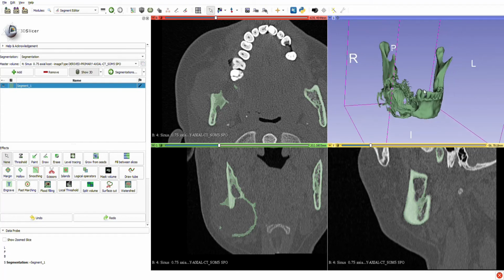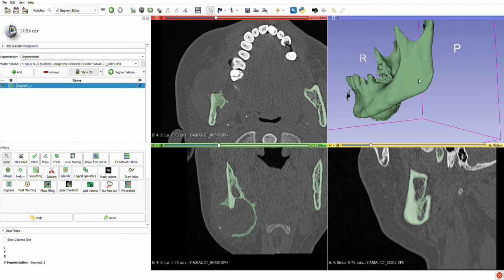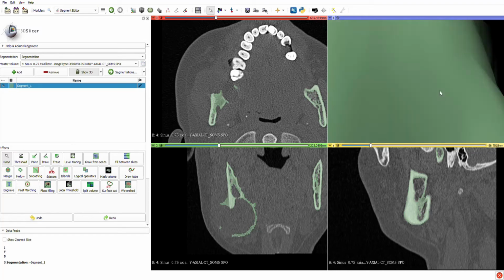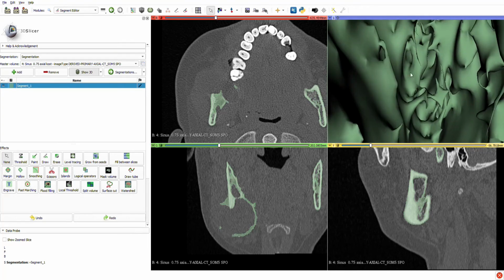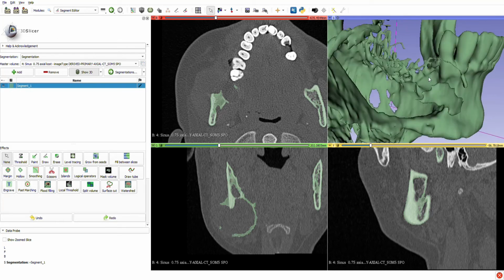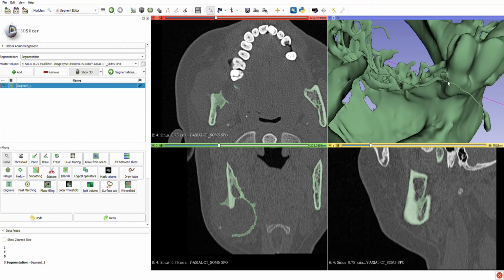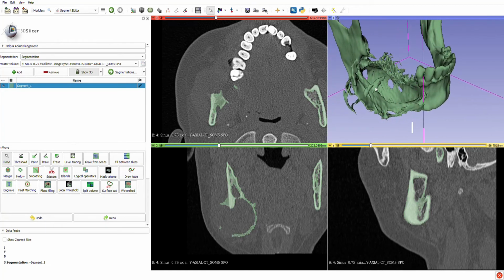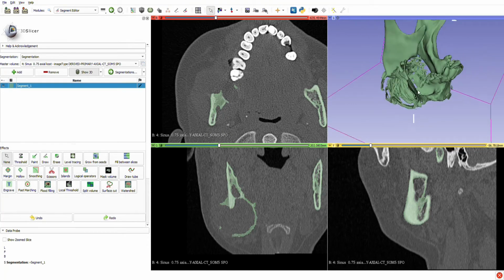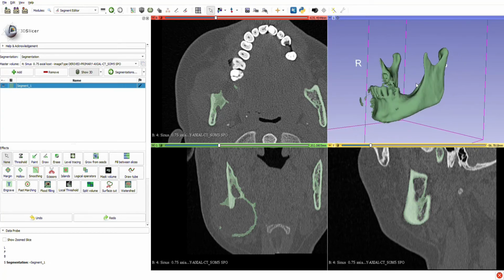So the next step is to import it into the other software for modeling. I will write the name of the patient here just for identification, and then clean up the inside. I'm not sure if you can see it like this, but if it is not connected to the outer shell of the mesh, it will be easily deleted. And maybe further delete some of the sticking parts, just to ease the printing, and delete the unconnected parts also, like those floating in the air. And then I will slice it in the slicing software and put it into the print.